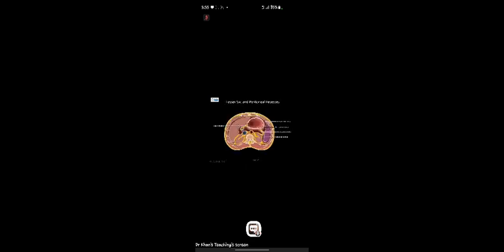Having said that, in this particular case, you can see the ascites, and this is the pancreas, and you can see fluid here. And if I ask you, where is this fluid? Because of your anatomy knowledge, it is not connected to anything. This is the stomach, this is the lesser sac, and kidney, and then will be the pancreas, right? So here you are, this is the pancreas. So this fluid, by definition, has to be in the lesser sac. So this is what we do in our exams. We ask the candidate, what is this? Where is this fluid? That kind of a thing.